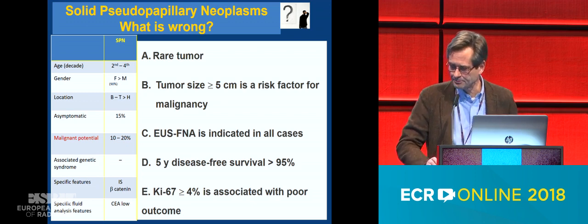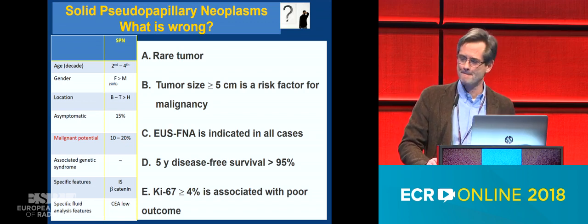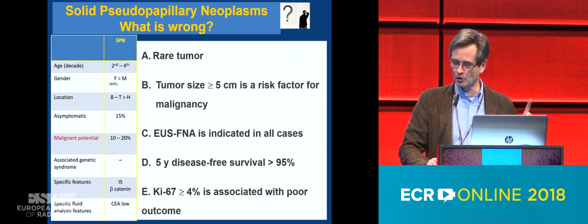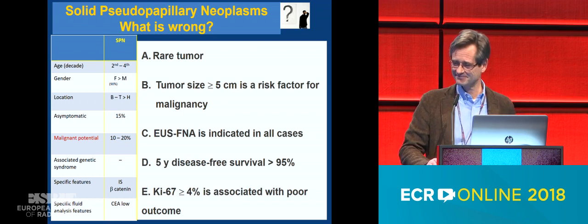So please vote now. Don't forget what is wrong. Okay, maybe you can see it.